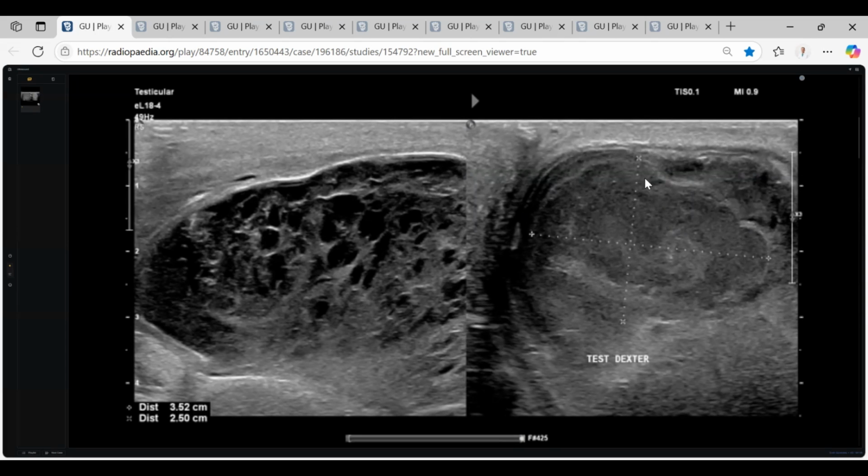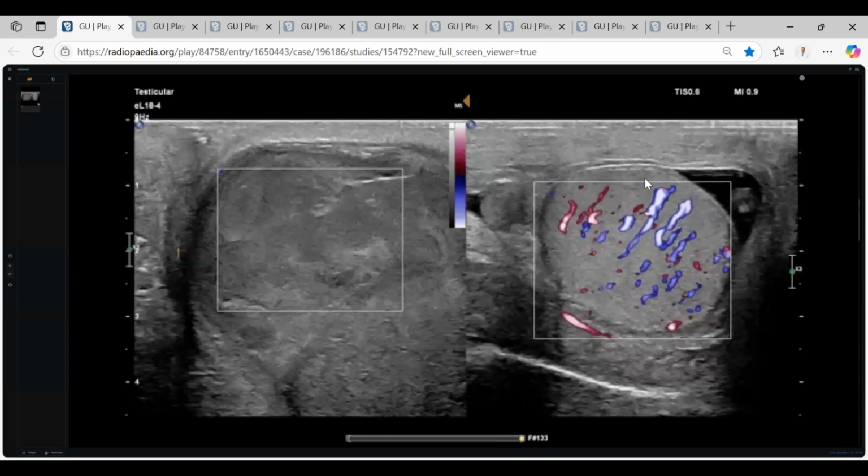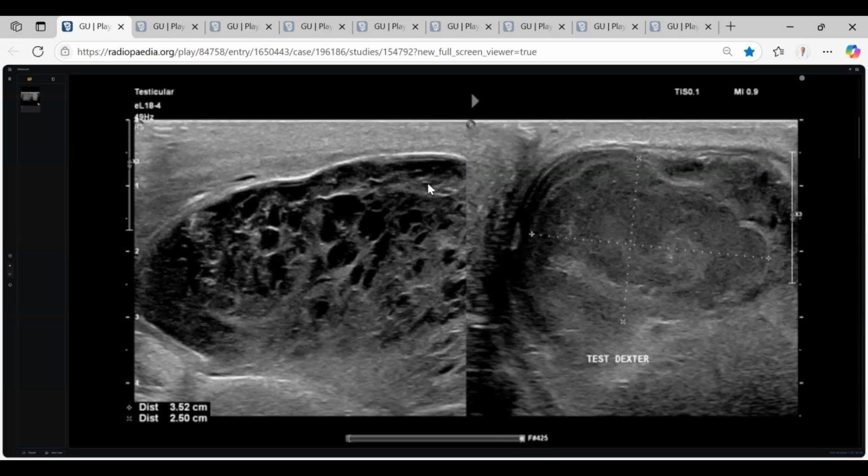One second. Compare the tunica here, very clear, very sharp, with here, see, depression, up, down. So tell me your final decision about the tunica. The tunica is not intact.